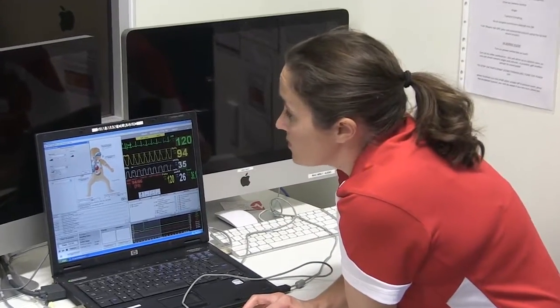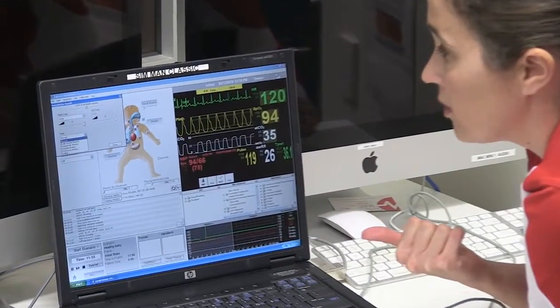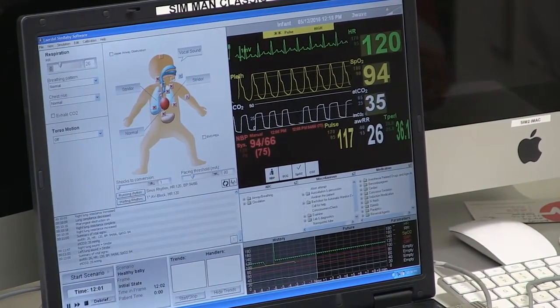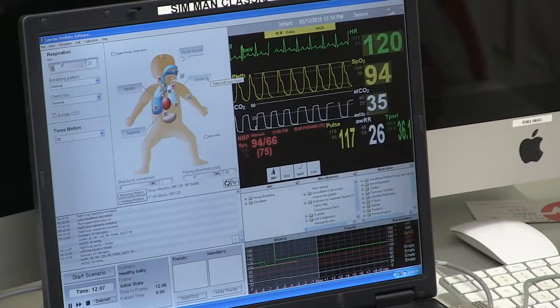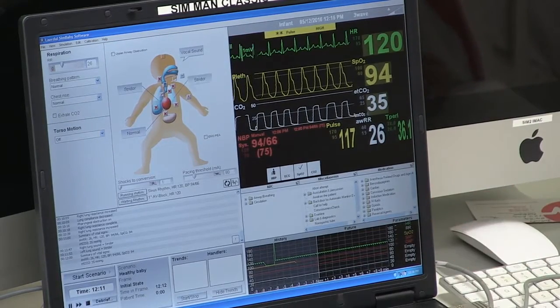Now the heart sounds, you can also adjust the volume. You can choose between early systolic murmur, a diastolic murmur, continuous murmur, and a gallop. And so close that out. So once I've hit stridor, you can see that it's actually stridor showing up on the boxes. So it's another easy check just to make sure that you're in the right mode.